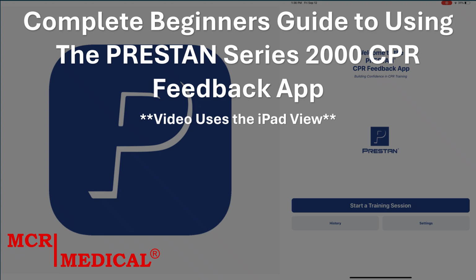Welcome to MCR Medical's Guide to Using the PRESTAN Series 2000 app. This video was made for the second version of the PRESTAN app at Update 1.7. We will be using an iPad in this video, but the PRESTAN app is compatible with most smartphones and tablets.